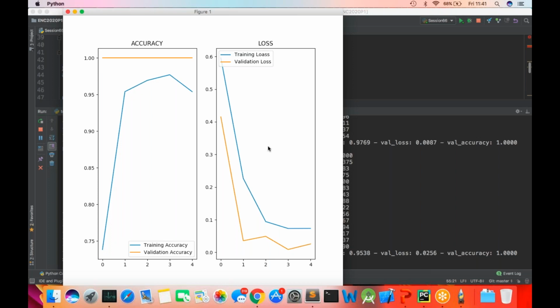Now, what I'm expecting is that these curves should be very near to each other. But there's a problem of overfitting or underfitting of the data. It means that your data set lacks information. So this is the kind of graph from which I need to make the decision that okay, is my model perfectly fine or not.